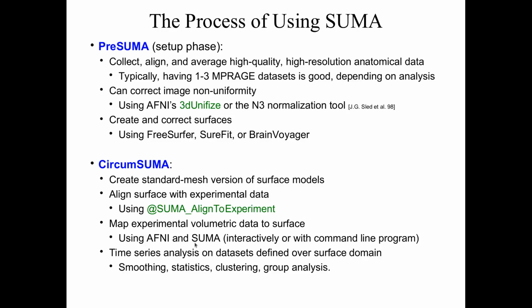So any program that does just a voxel-wise calculation for the BRIK/HEAD data sets, or what you would want to do as a node-wise calculation on a mesh, so just an individual spatial unit where you do some calculation, you can actually use those same programs on surface data sets. For any program that involves something like spatial information, that's going to be different because we're on a mesh, not in a volume. So SUMA has its own programs for things like blurring data, smoothing data, calculating distance along the surface, and some things like that.